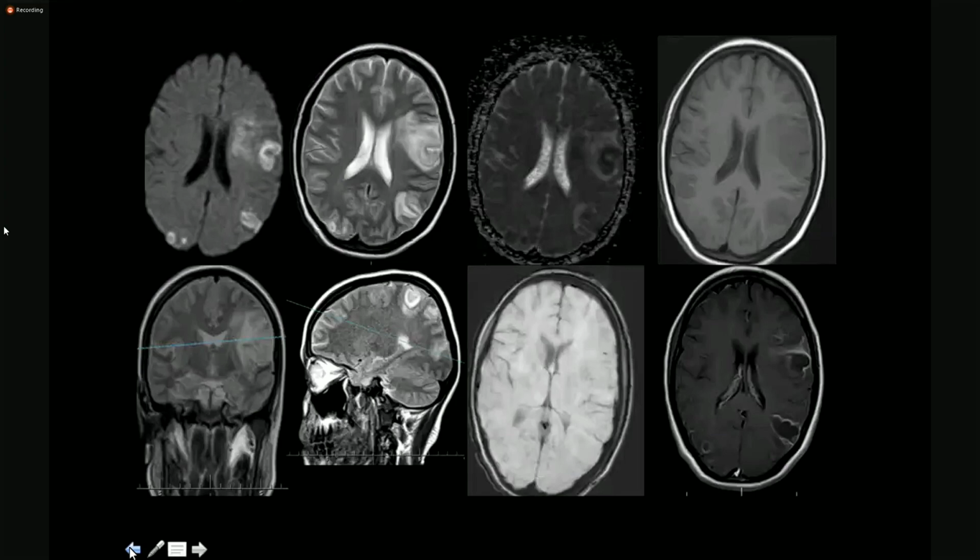मैडम, basically these are at the grey white matter junction. जी मैडम, मल्टीपल, जिस तरह मैडम ये प्रेगनेंसी hypercoagulable state होती है, तो इसमें ये multiple infarcts हो सकते हैं. इन्फार्क्ट्स होंगे तो वीनस होंगे ना, वीनस में तो ज्यादातर हेमरेज आता है, इसमें तो कोई हेमरेज नहीं नजर आ रहा. ससेप्टिबिलिटी मैंने आपको दिखा दिया उसी लेवल पे. जी जी, multiple lesions हैं, enhancing lesions हैं, ठीक है. इन्फार्क्ट की एनहांसमेंट भी गायरी फॉर्म होती है, इसकी एनहांसमेंट तो गायरी फॉर्म नहीं है, तो mass like enhancement दे रही है.